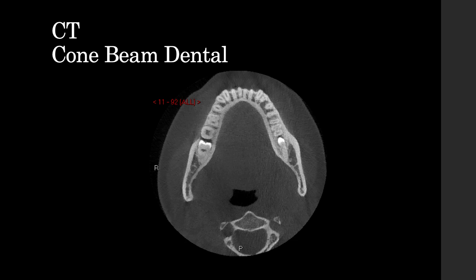You can really see the intricacy of the teeth. You can even sort of appreciate the inner trabecular architecture of the mandible on this scan as well. I think it's a really, really good scan. And so it's no surprise that the surgeons prefer this for surgical planning, because it is just so exquisitely detailed for bony architecture.